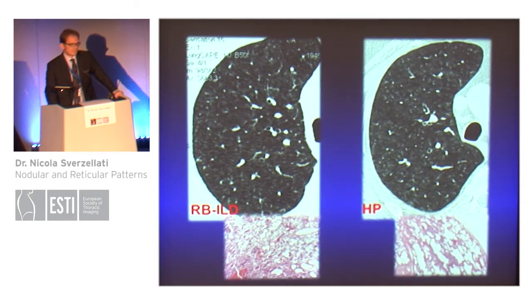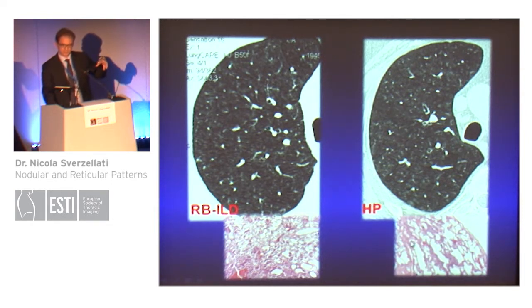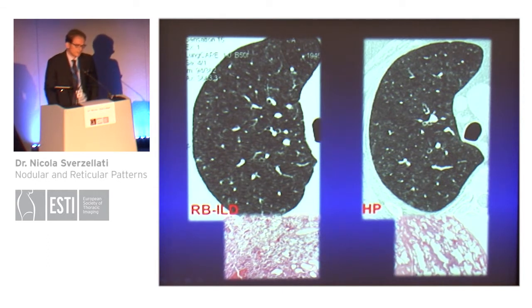And we should also consider that centrilobular nodules are generally associated with patchy ground glass opacity, because inflammation is also present in the interstitium and in the alveolar spaces around the centrilobular bronchiole. That's why we often see patchy ground glass opacity merging with these centrilobular nodules. But it is important to identify the centrilobular nodules, because patchy ground glass opacity is a non-specific finding. But if we can identify centrilobular nodules, then we can narrow the differential diagnosis.